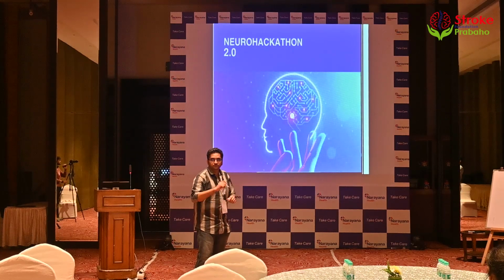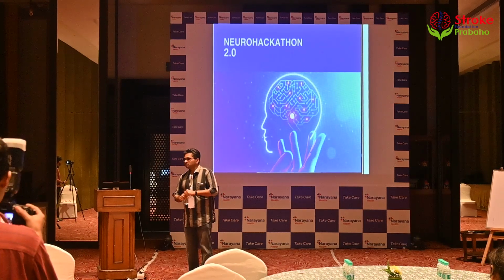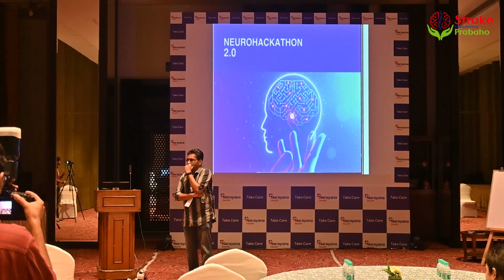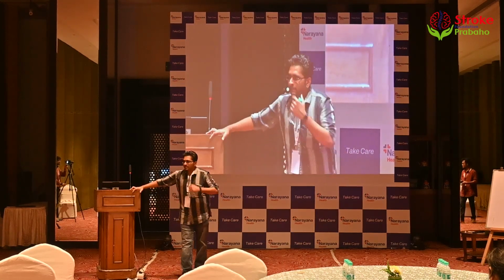Any comments? I think about the first scenario you spoke about, the triplicated MCAs or the duplicated MCAs. You still can have a direct to angio approach. You have opened up your normal looking vessel, but still if you have a significant duplicated MCA, then you are bound to have a hypoperfusion and a vasculopenic picture. That immediately gives you a clue that you have not opened all the vessels. That is equally true for a bifurcation and a trifurcation. You may open up 2 branches, still find that there is quite a deal of vasculopenia which is happening. So that is an angiographic clue of a missing vessel.